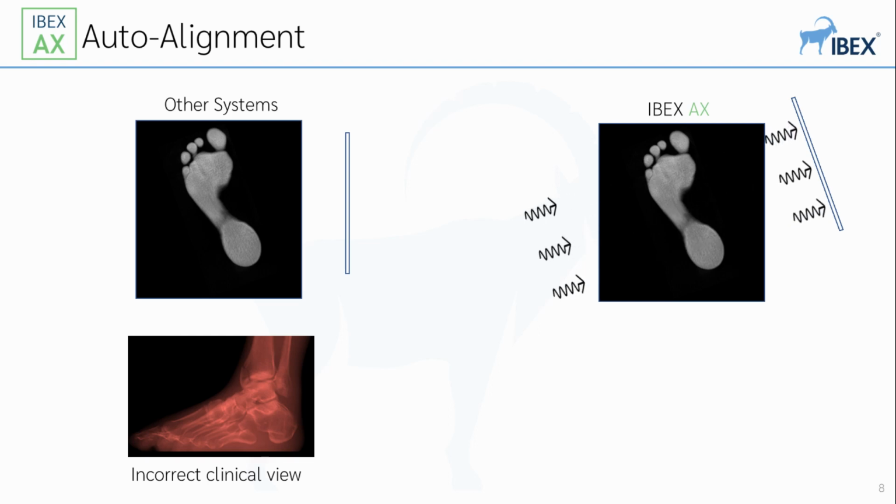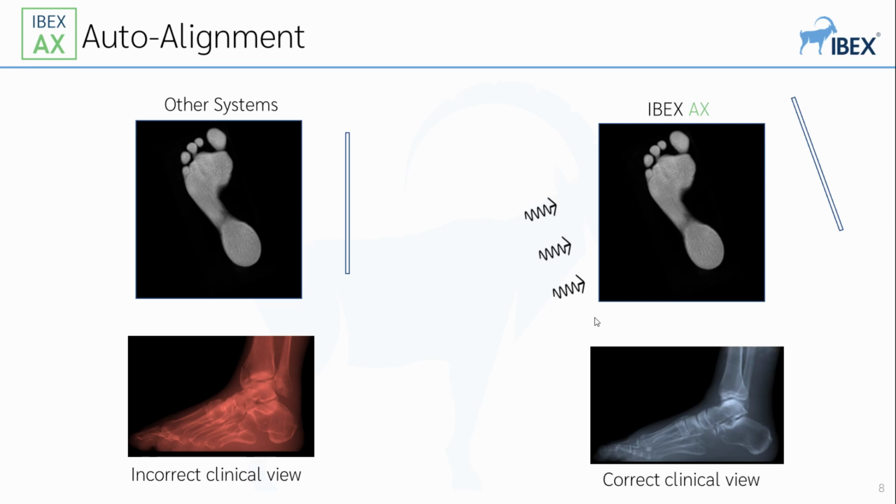The example shown here is of using AutoAlign to get accurate lateral views of the foot, but with AX auto-alignment, any clinical view can be reliably reproduced regardless of the patient positioning.